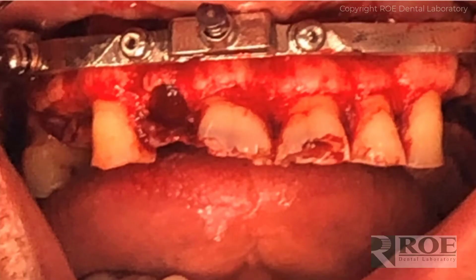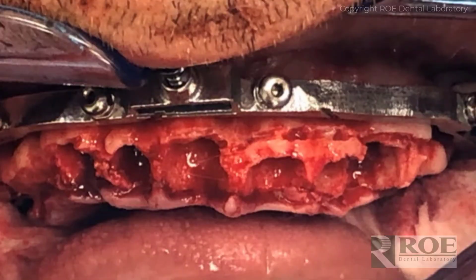And once the fixation base is in, then the next step is to level the bone, at least in this chrome type. We also have chrome natural, where these teeth would be extracted and you deliver an FP1. We've developed that over the past couple of years, which is really nice, because leveling the bone is not always the best option for a particular patient with an FP3. So deliver an FP1. But in this case, and in a lot of the cases, you'll reduce the bone down to the level of the fixation base.